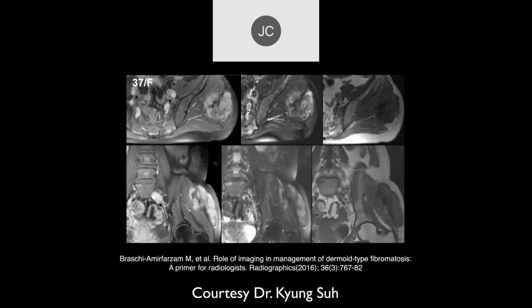It's heterogeneous. There are areas of the periphery which are kind of indistinct. Yeah, in some areas internally, probably more fibrotic. And what else do we see here that should make you very concerned?